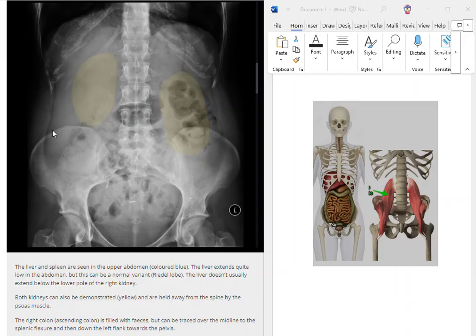All right, so if we take away the highlight, now you can kind of see it a little bit better, right? That left kidney just eludes me. Every time I take the highlights away, I'm like, where did the left kidney go? That one's tricky because it's superimposed with gas that's in the descending colon. So we'll look at that. We'll highlight those structures too as we go.